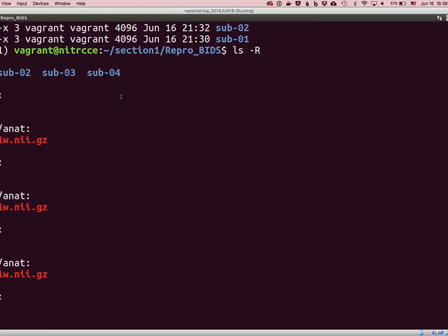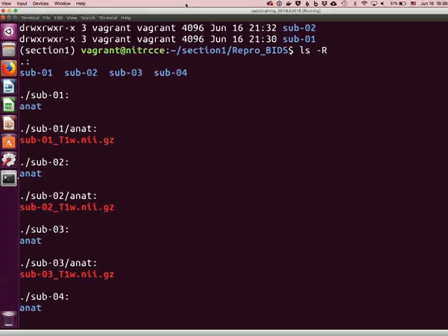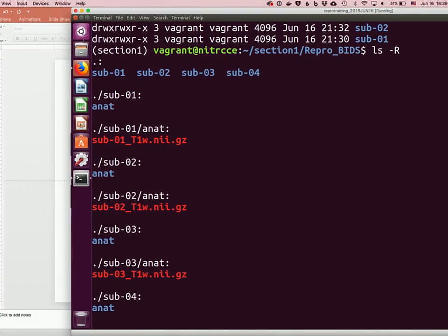Yes, Unix commands. If you had done the whole course in proper order, there would have been a little bit of basic education in Unix and Linux commands. So we kind of jump into this with that assumption, but we'll get through it.